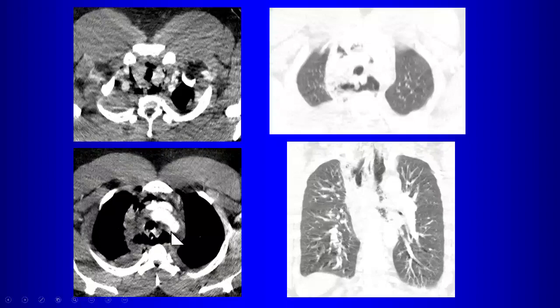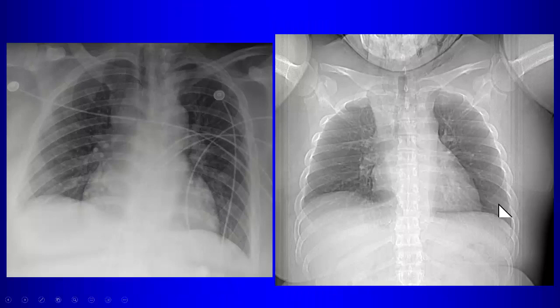So what's usually back here? Pneumomediastinum, also some small pleural effusion. What would you be concerned about? Boerhaave. Yes. So this is a patient with history of vomiting. This is Boerhaave. Right? So pneumomediastinum, pleural effusions, patient with no history of trauma, you worry about, ask about any history of vomiting. Could this be Boerhaave? This was a case of Boerhaave.